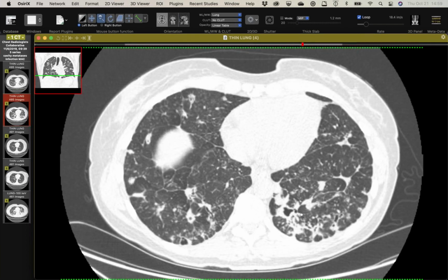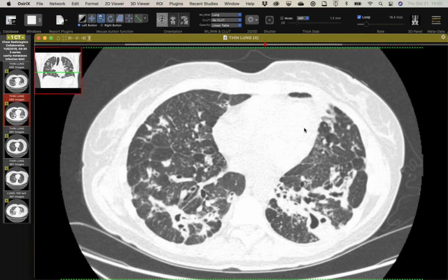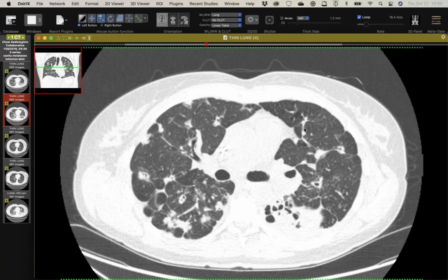So Jeff, she doesn't have pulmonary hypertension here. She does have a catheter in place. Is she probably on painkillers? Any chance that this is excipient lung disease? I don't think so. I mean, she's had that port for a long time. What does her PA look like? Does she have hypertension?